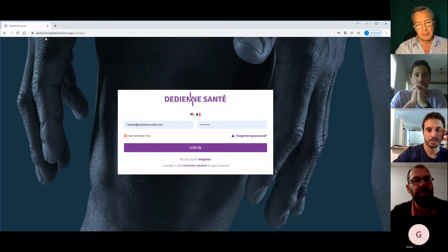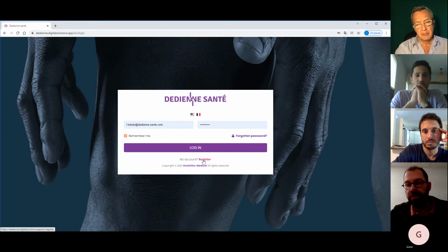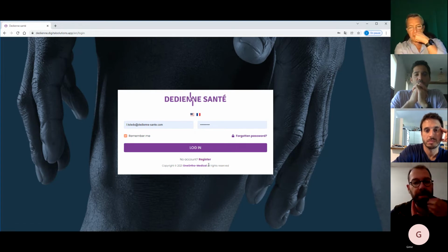It's dedien.digitalsolutions.app. So you have to register for it. You can create an account by clicking on the register link here, and we will give you a password and a login.